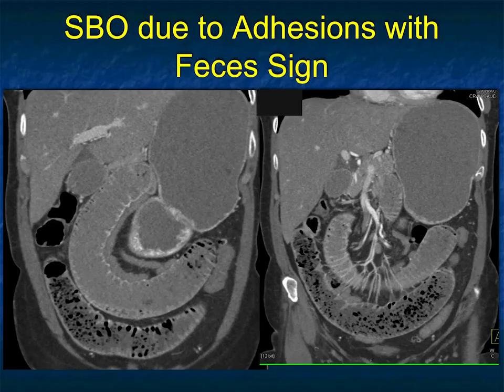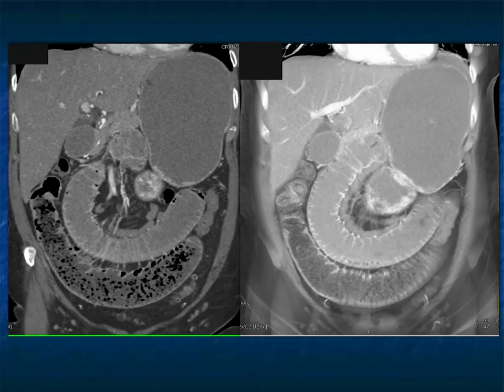Here's an excellent example. Abdominal pain and distension, markedly dilated small bowel. You can see the mesenteric vessels are stretched but patent. But look at this loop of small bowel. It looks like colon with stool, and you follow it right to this point here. And there's definitely a transition point in the small bowel. Here it is again very nicely with a volume rendered view as well.